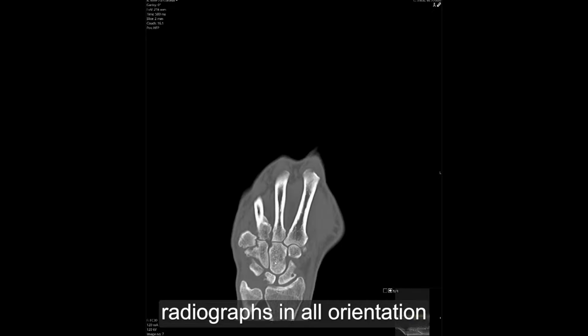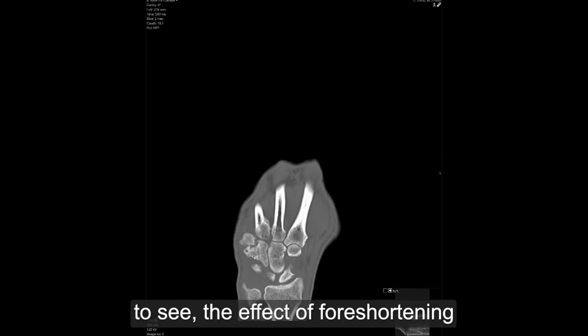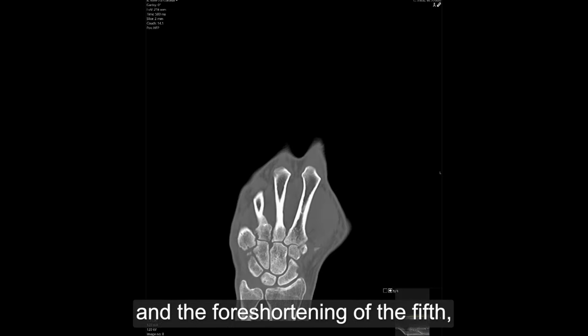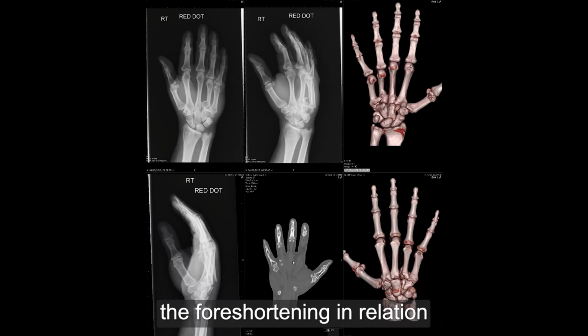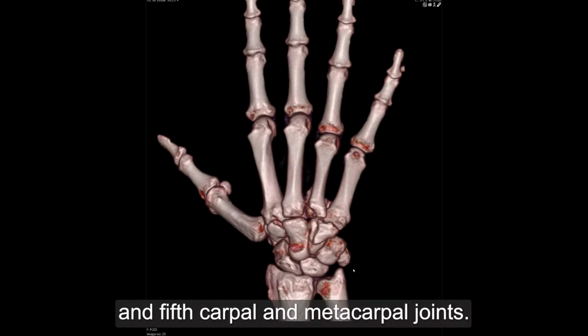And this shows you that it is important to look at all radiographs and all orientations to come to an outcome. And this is a 3D presentation that we sometimes use in musculoskeletal imaging to give the surgeon the ability to see the effect of foreshortening and where the fracture is. Sometimes it can be helpful in detecting fractures. Here you can see the bony fragment and the foreshortening of the fifth, more than fourth, metacarpal. And you can see the foreshortening in relation to the second and third metacarpals due to dislocation at the fourth and fifth carpo-metacarpal joints.